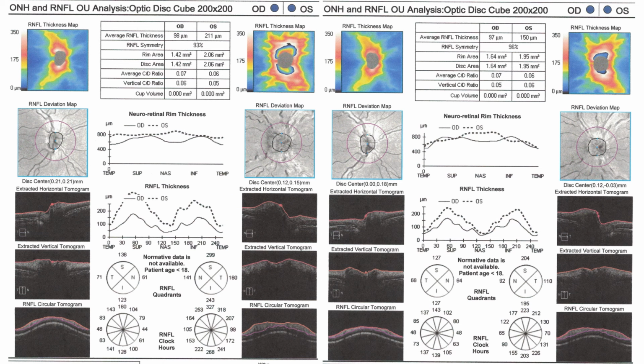So that patient had HLA-B27 uveitis, and she developed 3+ disc edema due to inflammatory perineuritis. The initial retinal nerve fiber layer thickness measured 258 microns in the left eye and was normal in the fellow eye. She was started on oral steroids. After a couple weeks of oral steroids, the nerve fiber layer thickness decreased to 211 microns and then 150 microns. She is continuing her steroid taper, and her visual acuity is 20/20 at this point.